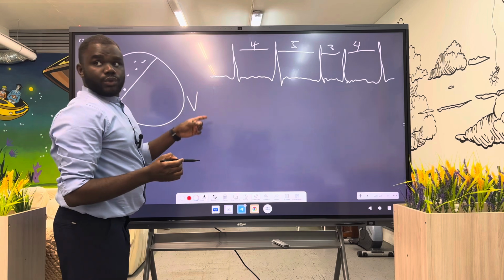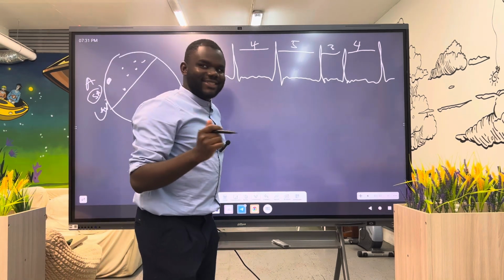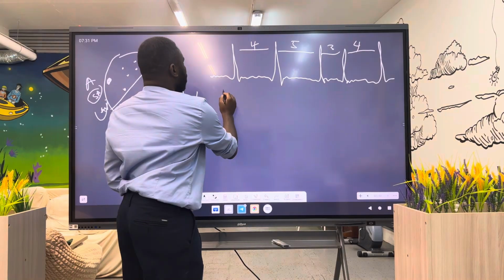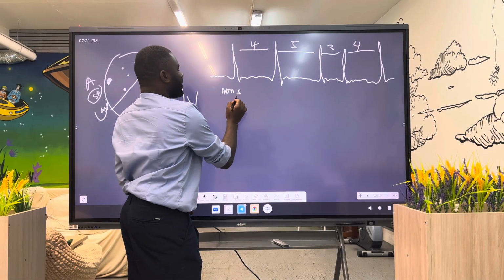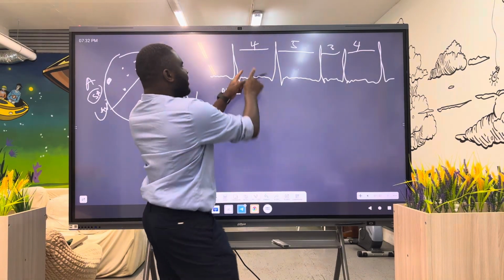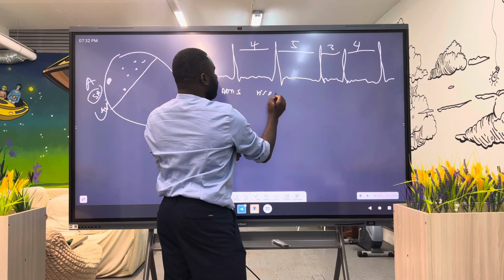The first thing is whether it is sinus or non-sinus. If there is no clearly defined P wave, it is known as non-sinus from our last class. The second thing is: is it regular or irregular? If the distances are not the same, it is known as irregular.